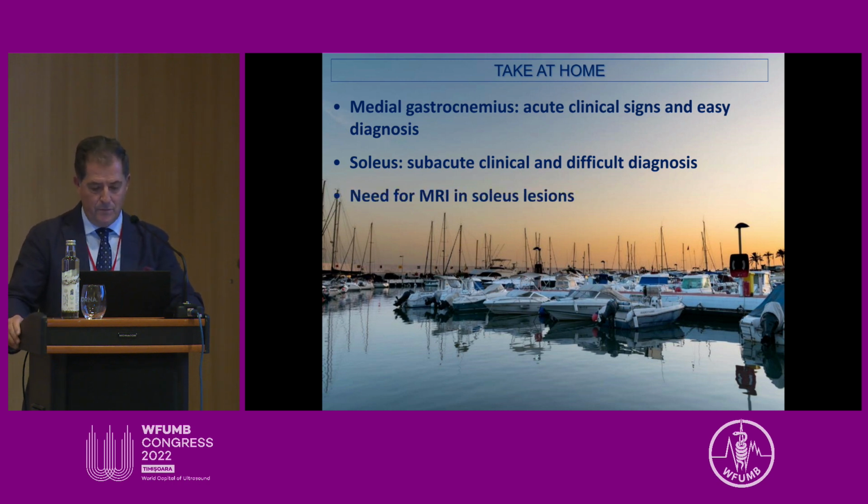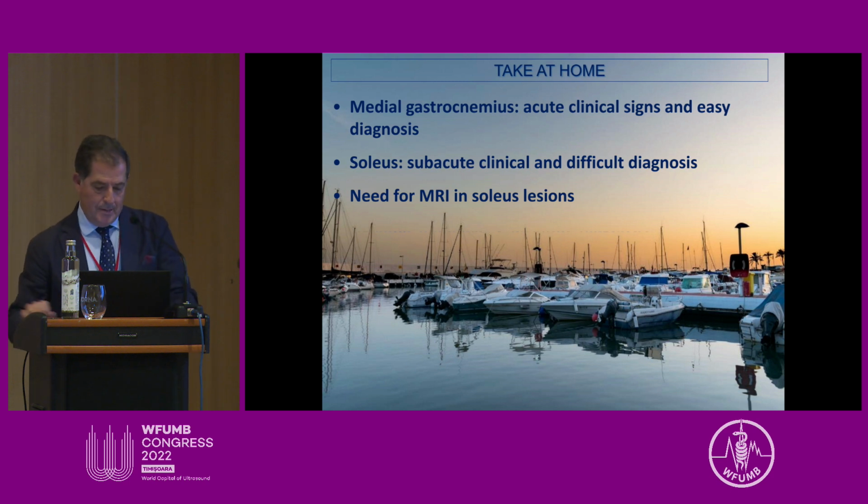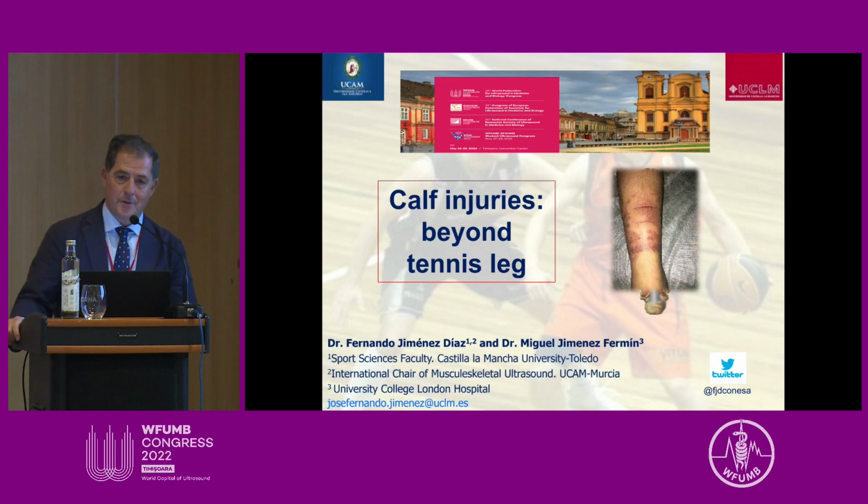Normally, if you have doubt, you should look at the MRI. And always in ultrasound and muscle examination, the dynamic maneuver is very, very useful to confirm this kind of injury. Thank you very much for your attention.